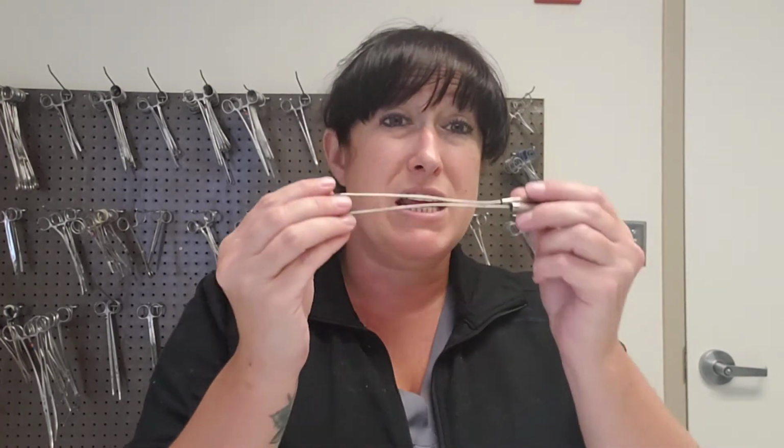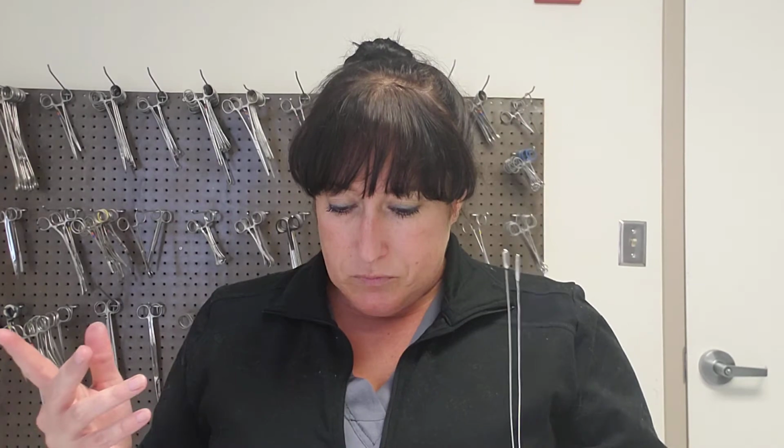There is another dilating instrument I'd like to show you, and that's these. These are called Garrett dilators. They also come in smaller to bigger sizes, and they come with many of them together. And these are actually more of a vascular dilator, and they do look like a probe, but they are categorized as dilators. And you can use these to dilate arteries. In the book, it specifically says coronary arteries, but you can use them to dilate other arteries.